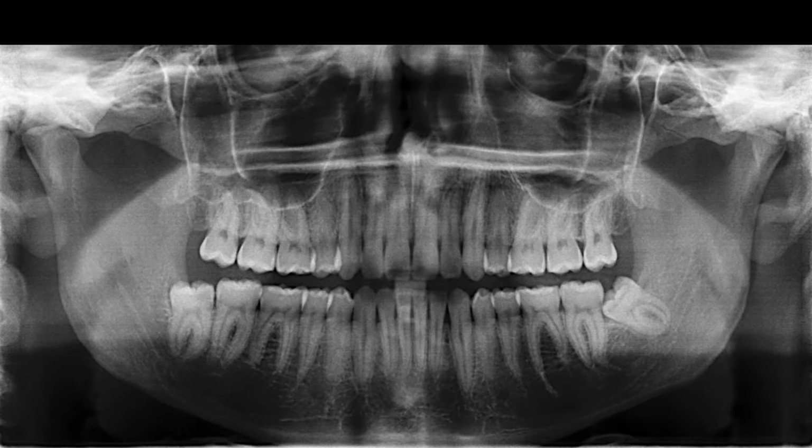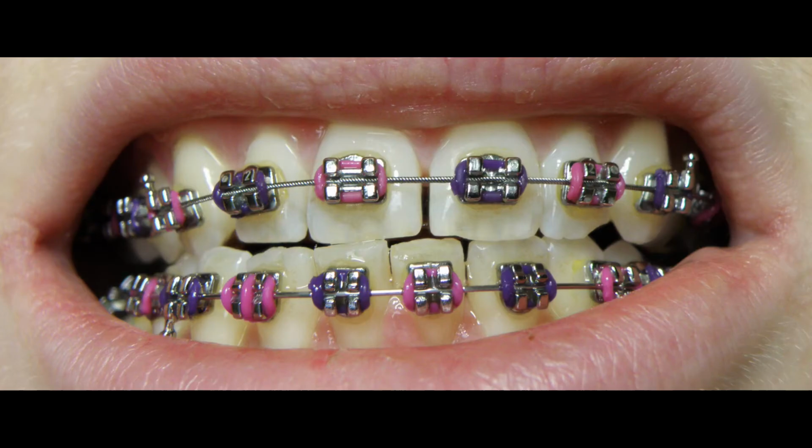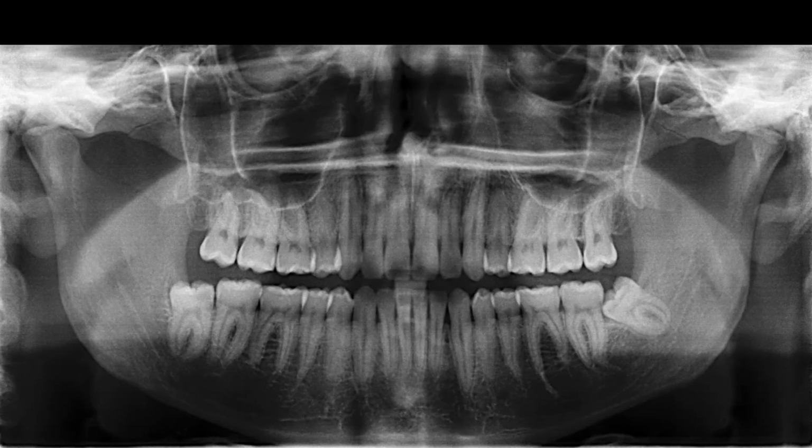Thanks for joining me. In this video, I'm going to teach you how to read a panoramic x-ray. A panoramic x-ray is typically taken by an orthodontist, general dentist, or an oral surgeon. Usually it's used to show you the position of your wisdom teeth. So in this video, I'm going to teach you how to read a panoramic x-ray.